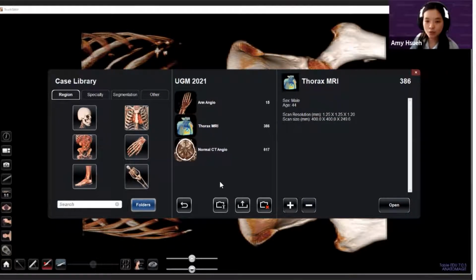And once you have that, or if you have any folder, you can actually rename it as well. If you decide you don't like this name anymore or it's no longer relevant, then right here, there's a little T over the folder. If you click on that, you can rename the folder to something else. So you change it up.